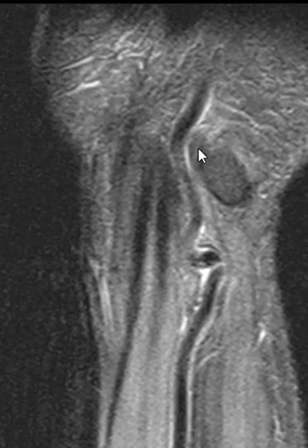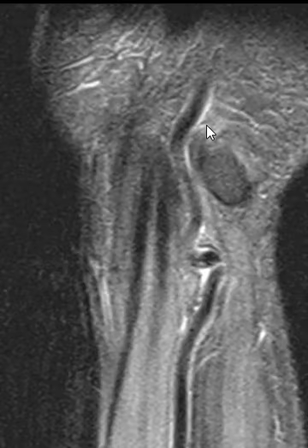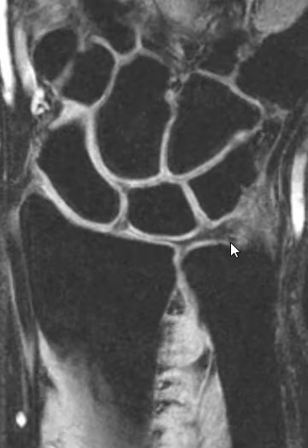But other people I've seen with hypothenar hammer syndrome have had dissections or aneurysm right in this region here, adjacent to the pisiform or hamate bone. And this one again is neural compression here that I think would explain the ulnar neuropathy. This is the triangular fibrocartilage, looked great. And here's that ulnar artery again.